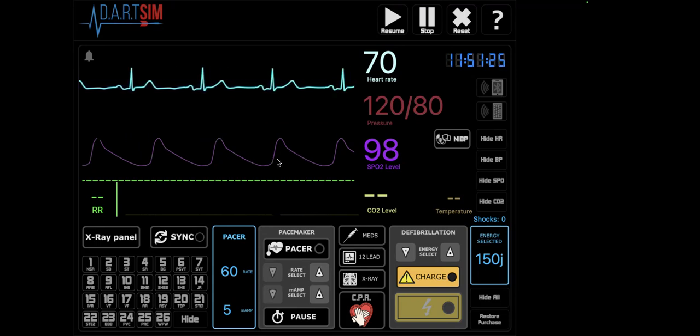So if you had a really low blood pressure that would give you poor perfusion to your digit, then you would see a very small, dampened waveform. And often when the patient is hypertensive, you will see a tall waveform. So use that to your advantage when you are assessing patients.